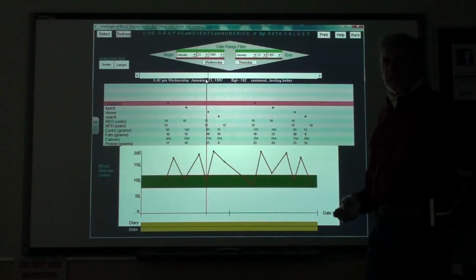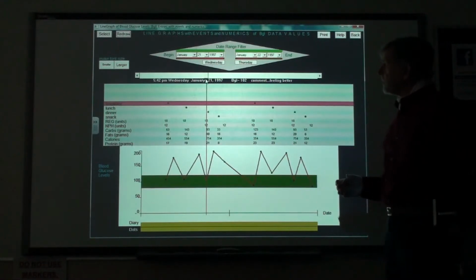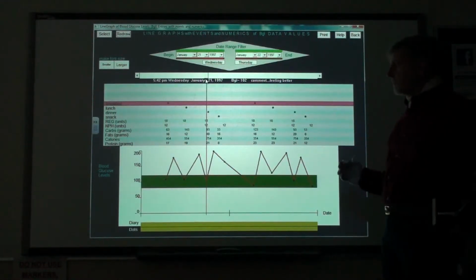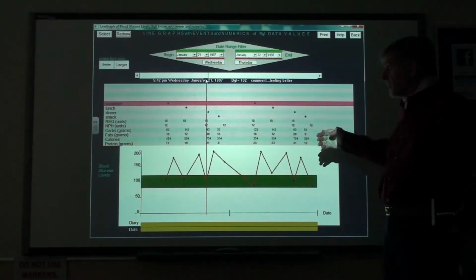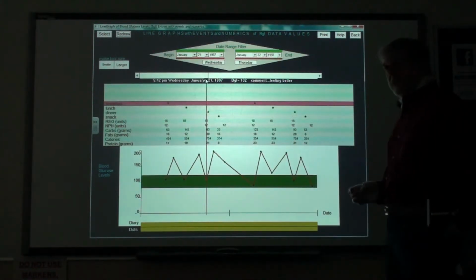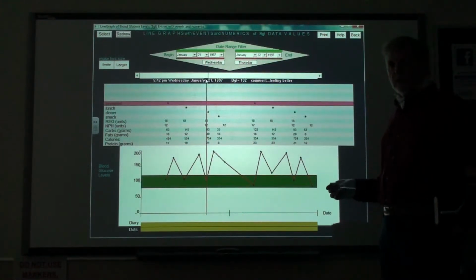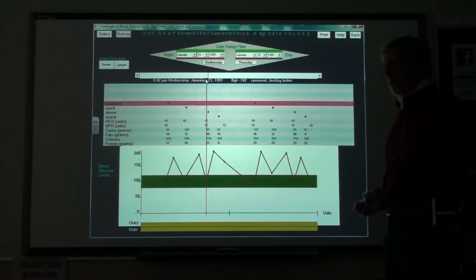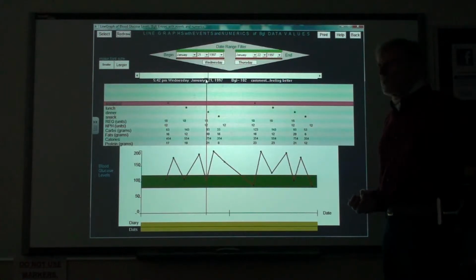So these sample graphs are shown to illustrate the analytical power of the line graph with events in numerics. When you put on the same screen your insulin dosages, your carbs, fats, calories, and proteins above the blood glucose readings as it's tracked in time during 1 or 2 or 3 or 4 days, then you can see and analyze which is failing and which is working. So this is a powerful graph aimed specifically at the hour-by-hour analysis that needs to be performed by a type 1 diabetic when their readings go out of the target zone.